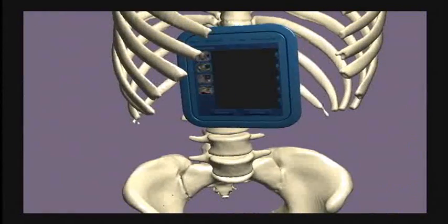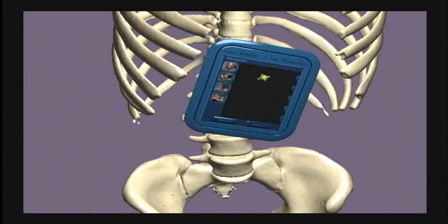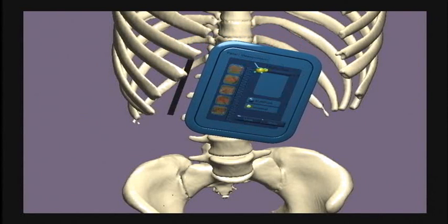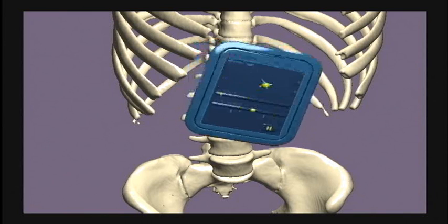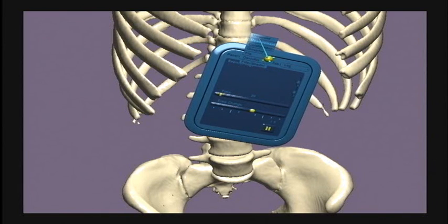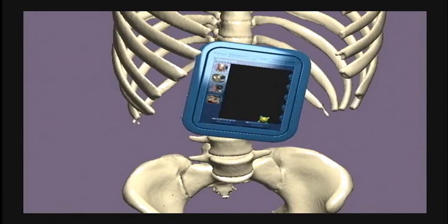This is the toolbox. You toggle the toolbox with a simple button press. It always floats over the left hand. The toolbox presents the user with iMedic's tool set on various panels consisting of standard 2D widgets and some natively 3D ones as well.